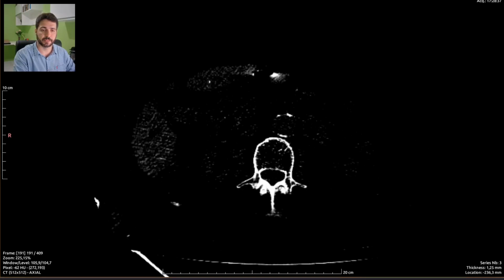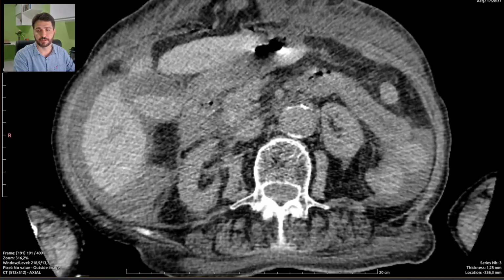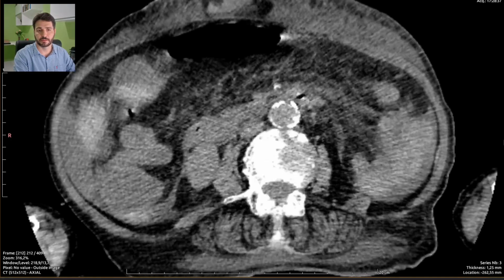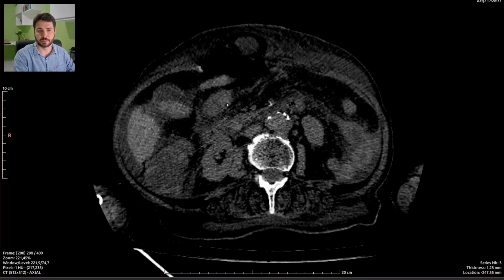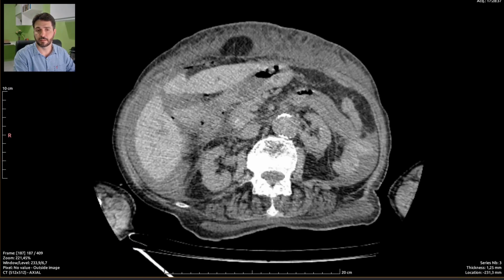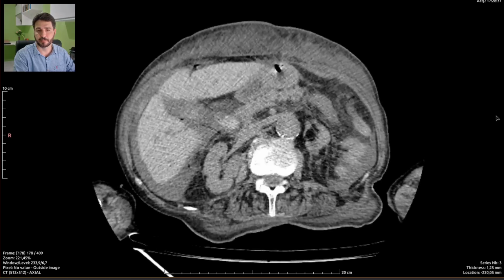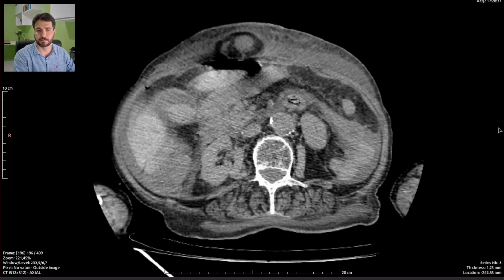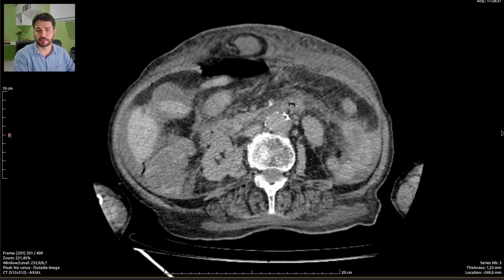Also, for the cause of the jaundice, we have here the gallbladder, as bad as we can see, because this is a very badly done exam of a very badly diseased patient. So there is major calcified content inside the gallbladder.